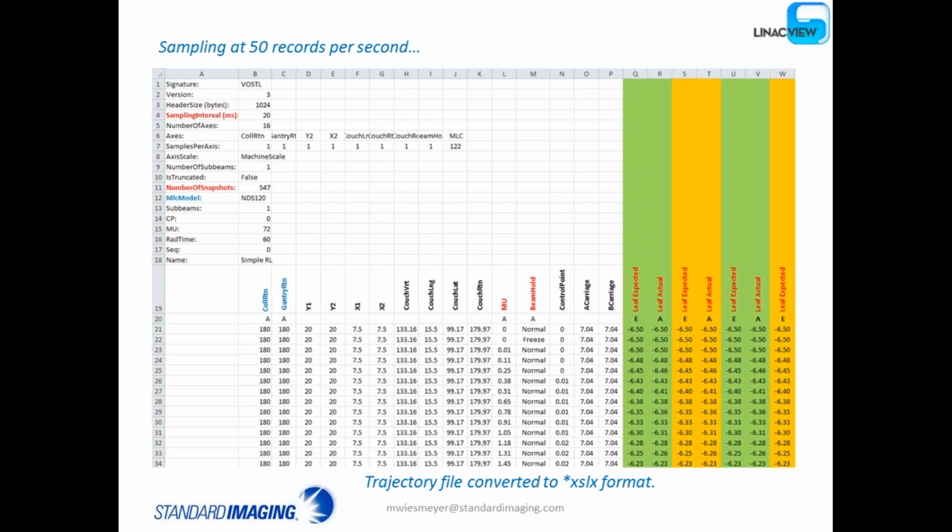You know that Dynalog files are CSV files essentially, and you can just read them directly. But this is interesting. You can see in blue collimator rotation and gantry rotation. The next columns are jaw positions, table positions come next, monitor units, whether there's a beam hold or not.